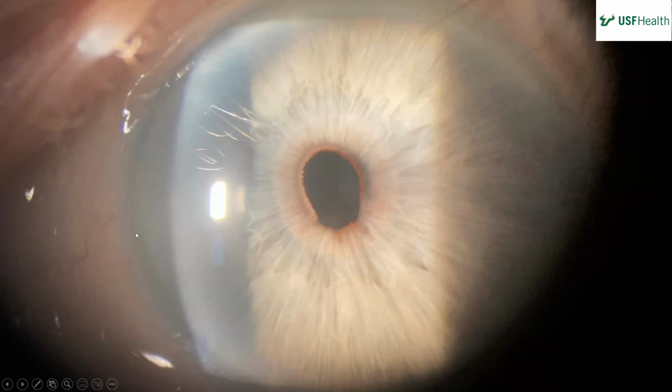What makes you say that? All of the irregular ridges around the pupillary margin. I don't think that has to be synechia. I think it can just be the edge of the iris with a little gap on the bottom. I don't think she actually had synechia. Okay, this picture doesn't show much.